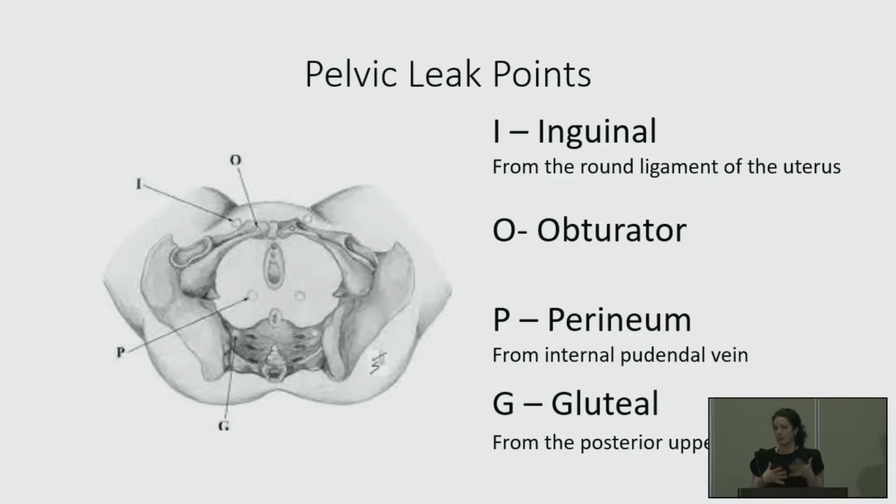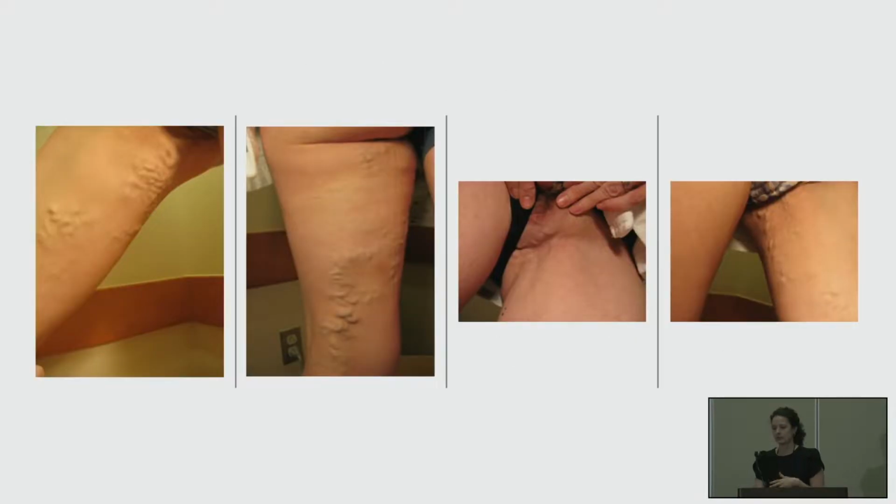So in my experience, I see a lot that come from the perineum, and it's easy to identify. As we can see here in these pictures, it's showing different presentations of where these veins are coming from. So it's not going to be your typical medial calf varicosities. These are going to be out-of-the-ordinary varicosities, and you're going to need to stand your patients up. Look at your patients, have them loosely dressed, either shorts or a gown, so you can go up high.